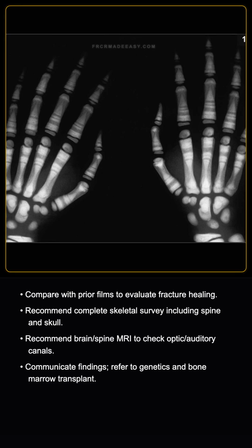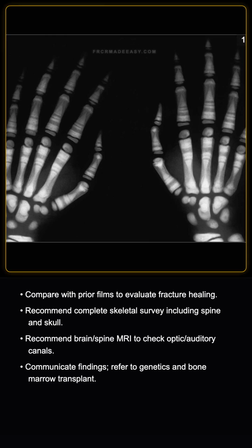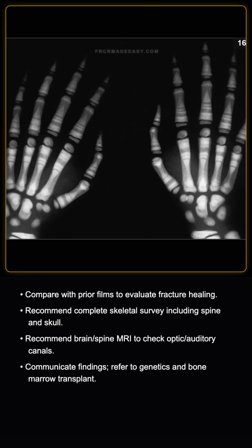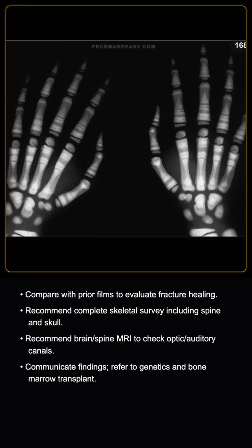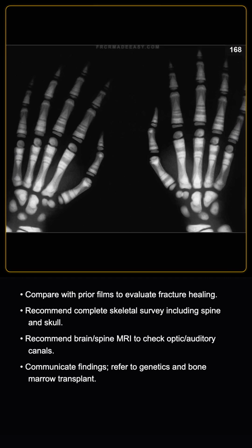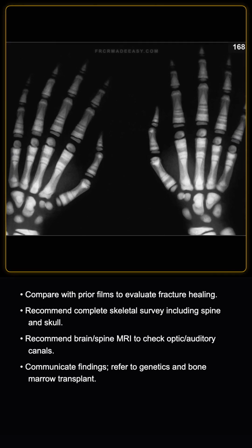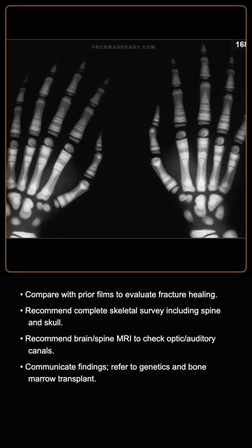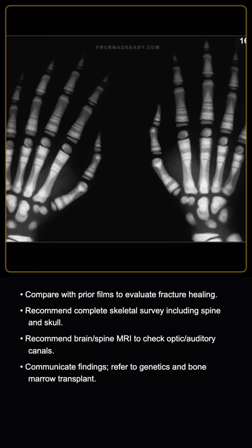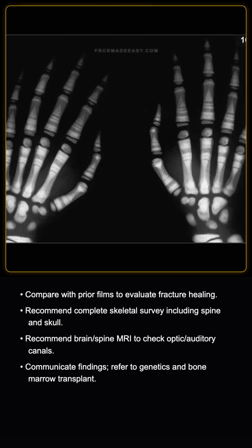As a radiologist, I would recommend comparing these radiographs with prior examinations to evaluate for any occult or healing fractures. I would suggest obtaining a complete skeletal survey, including radiographs of the spine, knees, and skull, to assess the extent of osteopetrosis and rule out cranial foraminal narrowing. I would recommend a brain and spine MRI to evaluate the patency of the internal auditory and optic canals and assess the degree of bone marrow space obliteration.